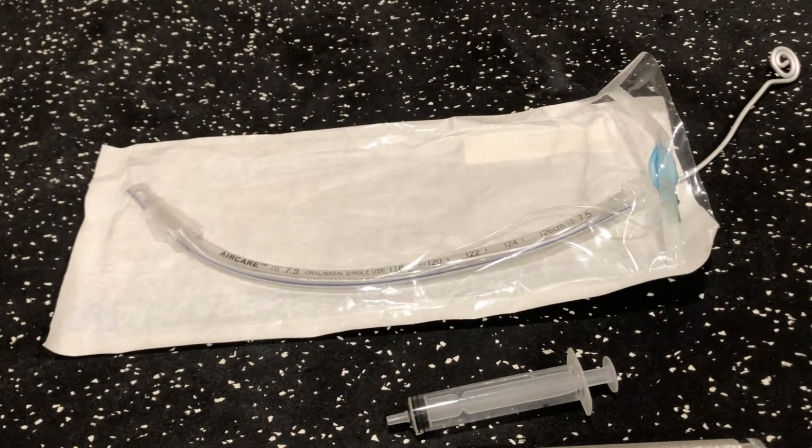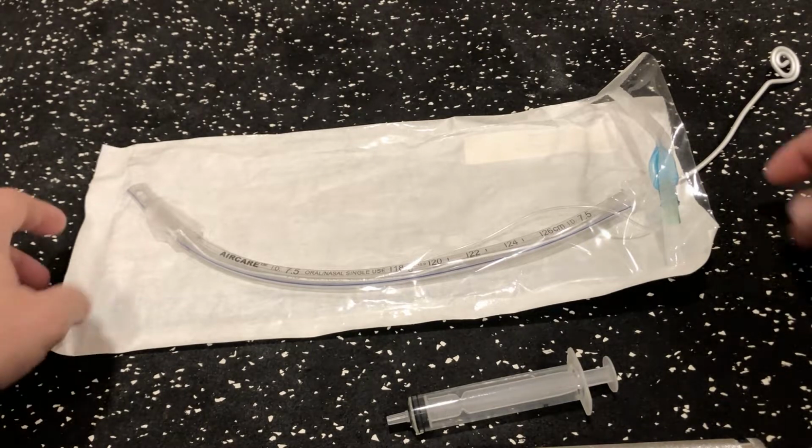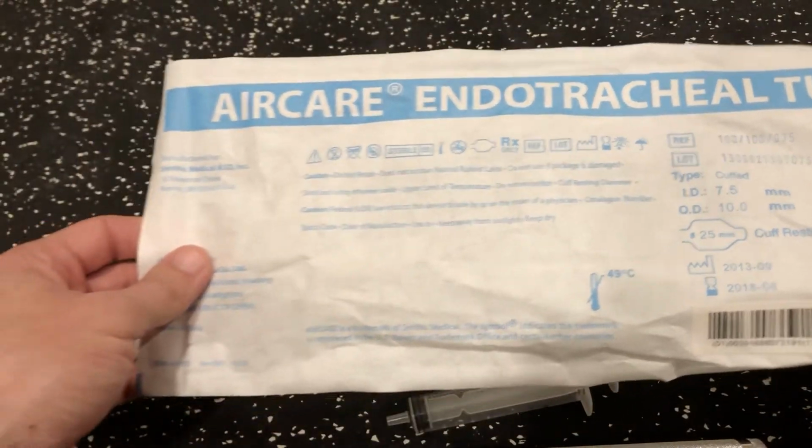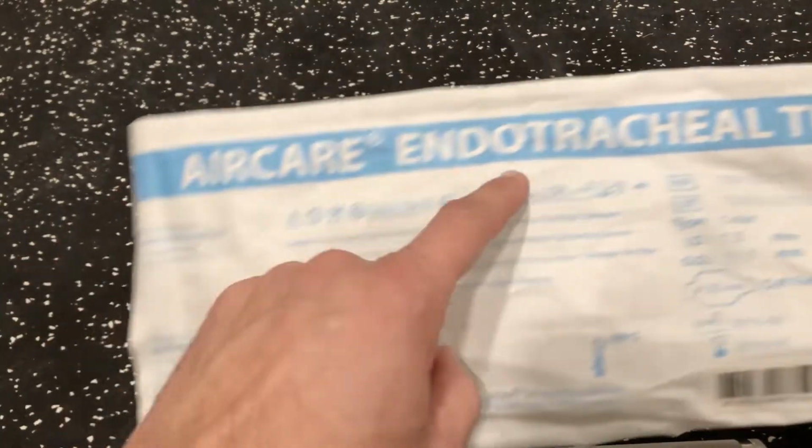What we want to introduce in this video is some of the common airway tools that we would use for securing an airway in an emergent situation for a patient who wasn't ventilating. So this would be for a situation if the doctor calls for a tracheal tube, intubation kit. One of the first things we'll need is what is called an endotracheal tube.